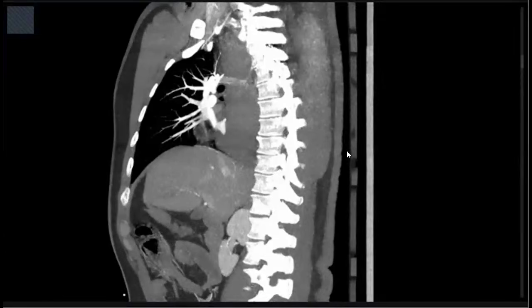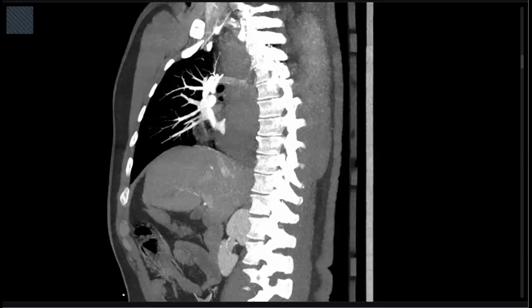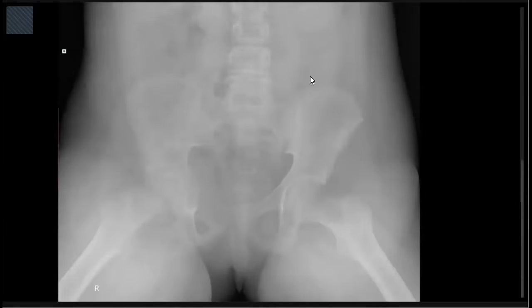What's your management? I would urgently escalate to the cardiothoracic team and the interventional radiologist to see if they can stent it, because this is a pseudoaneurysm and they can be stented. However, the discussion needs to take place with cardiothoracic. The priority will go with the interventional radiologist, and I will speak to them first. That patient also requires resuscitation in the A&E department.